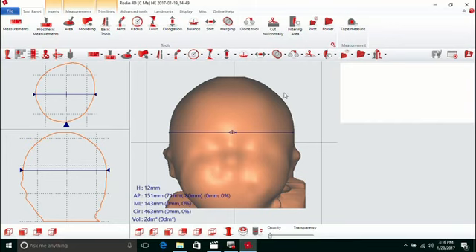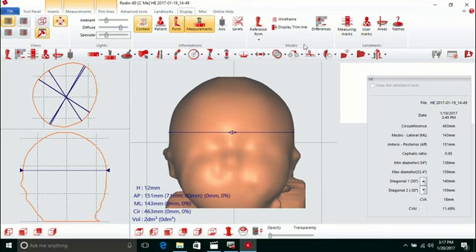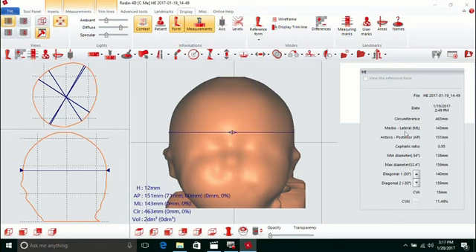From here we want to create the measurement box. So top menu line, click on display. Now we're going to click on the trade tool right here. Left click on that, that brings up our preview window of our measurements: circumference, MLAPs, cross cranials, and the CVAIs.